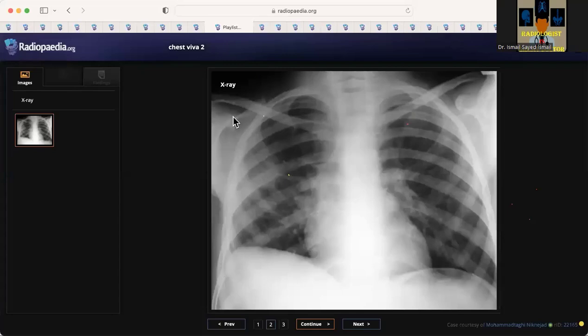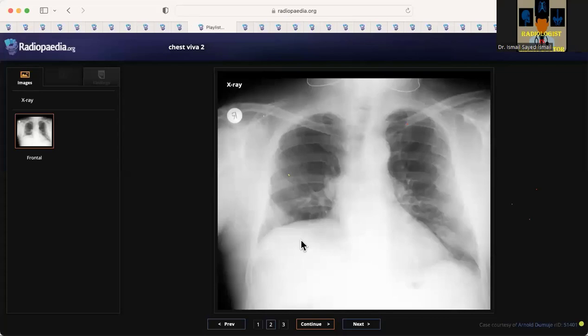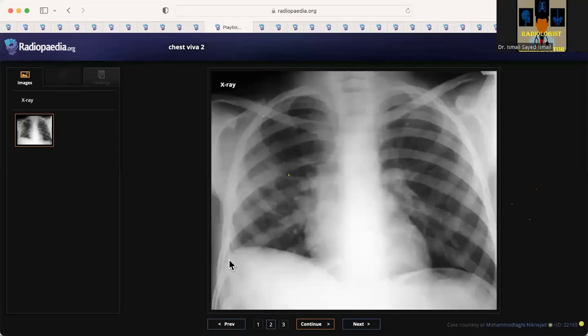So it's more lateral, just comparing it to here. If you can see here, the hemidiaphragm is just completely raised, but here it's more lateral. So whenever you have an opacity, just look for any other causes. If you're thinking of infection, look for other complications, which could be a cavity, could be pleural effusion. Don't forget subpulmonic pleural effusion. Okay, well done.